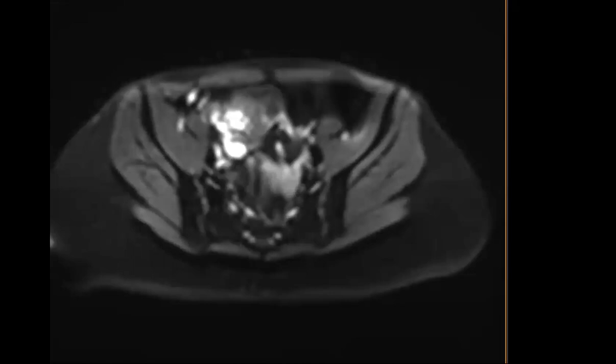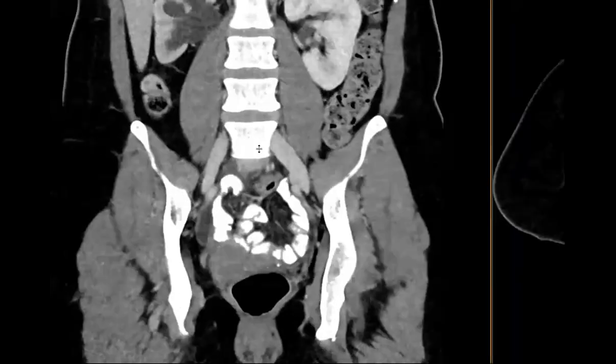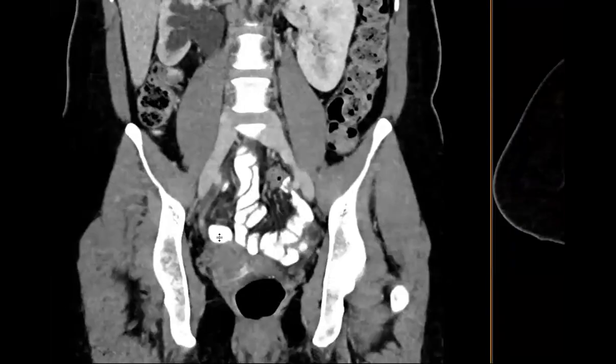Sorry, I don't think I'm showing you the right sequence. But anyhow, this went to the OR. We prospectively called this endometriosis. They went to the OR, and this is path-proven endometriosis. A few years after fibroid surgery, in the vaginal cuff.